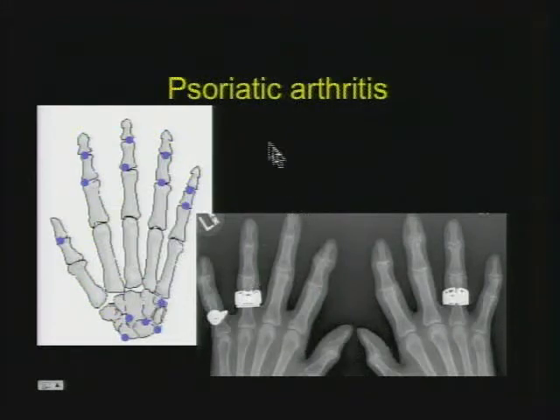When we contrast it to psoriatic arthropathy, which is very similar if it involves PIPs and DIPs, we do have a little bit of difference in our erosions at the beginning of the arthropathy. The other thing you'll notice about psoriatic, it does like the wrist, and it likes the intercarpal area. So it would not be seen in erosive OA that you'd get that. And these are very far away, and they're trying to get all the joints in there.